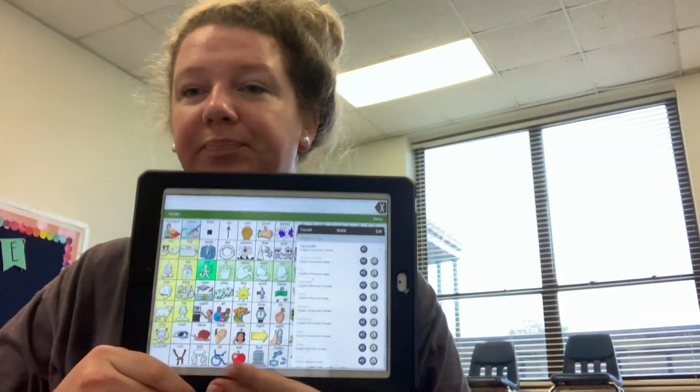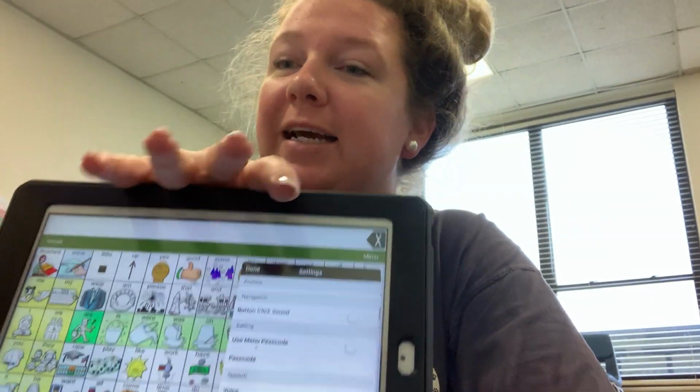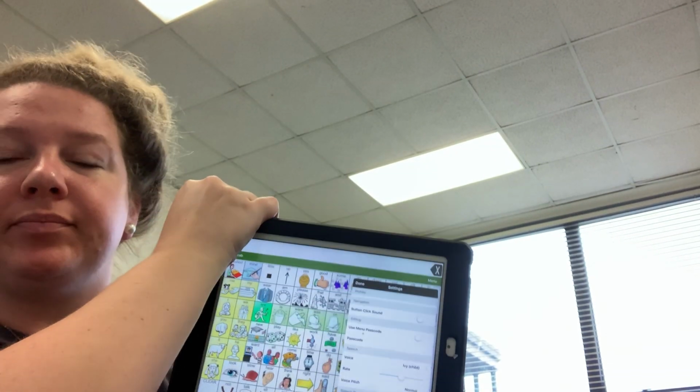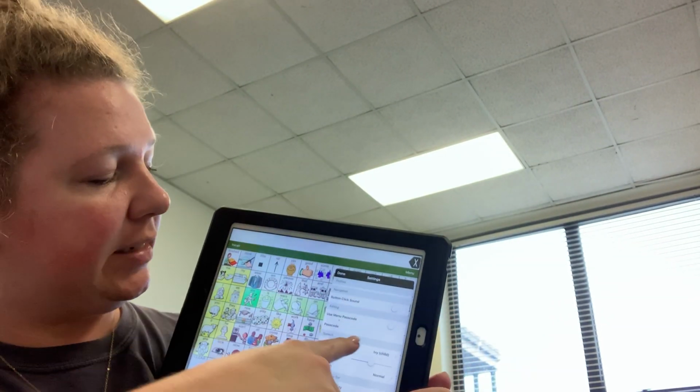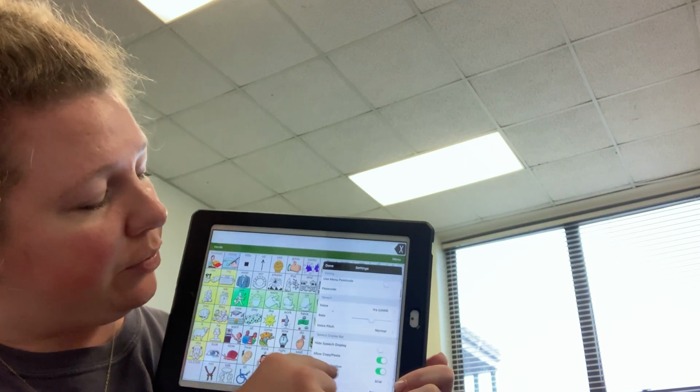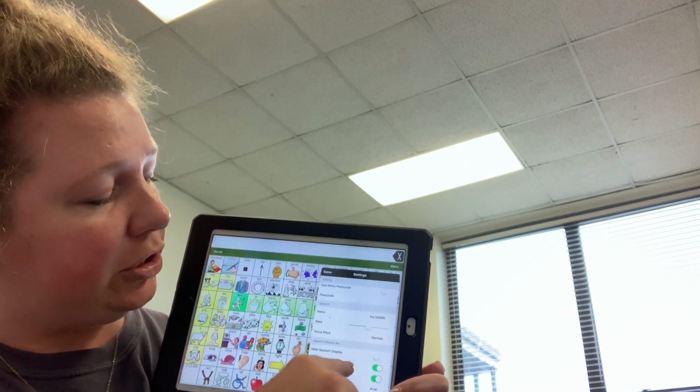Here, I'll hold this back here. Sorry, trying to do this backwards is kind of difficult, so let's see if I can rearrange to do it this way. Here we go. Okay, so that's a little bit easier. So yeah, I can change the voices, I can change the rate, and you can change the pitch.